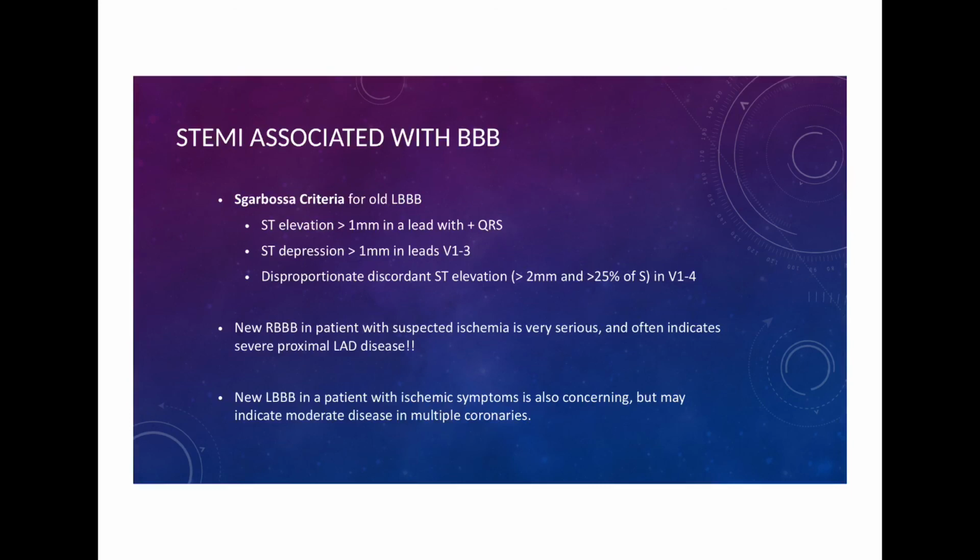We're all trained to be really concerned about patients with bundle branch blocks. I'm sure we've all heard before that new left bundle branch blocks are especially concerning. But if a patient has an old bundle branch block, there are criteria, especially in a left bundle branch block, in place to identify whether ST elevations in that setting are concerning or not. Those are called the Sgarbossa criteria, and they're listed here.